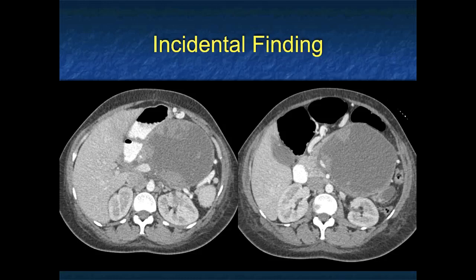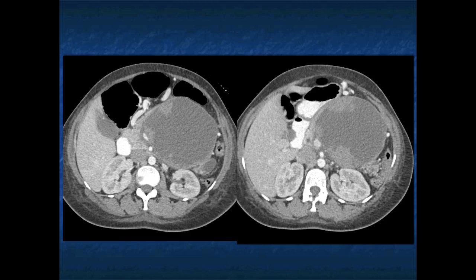What about this case? Again, a cystic lesion, but there's nodularity. It's big. Again, I got to be thinking MCN, with those nodules being high-grade dysplasia. But you also could think about cystic and solid tumors like SPEN tumors. That's a possibility. Serous cystadenoma with nodularity on the wall, unlikely.